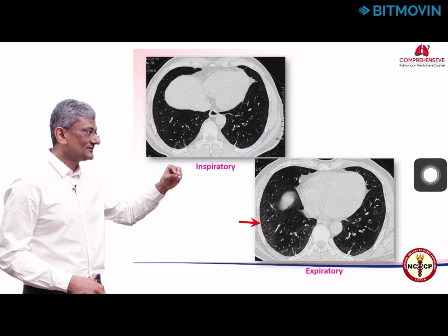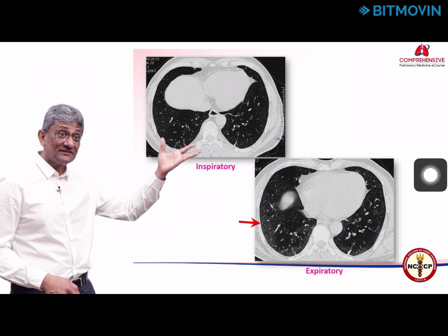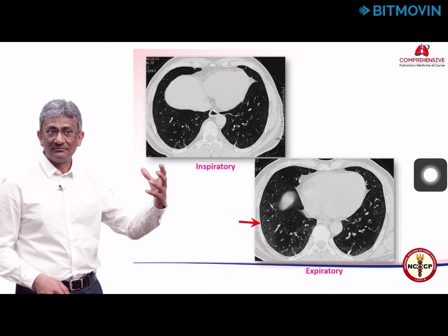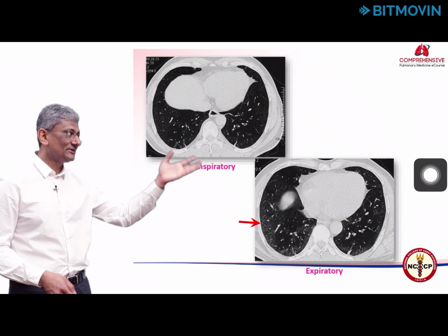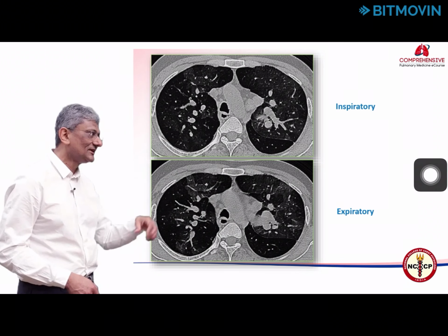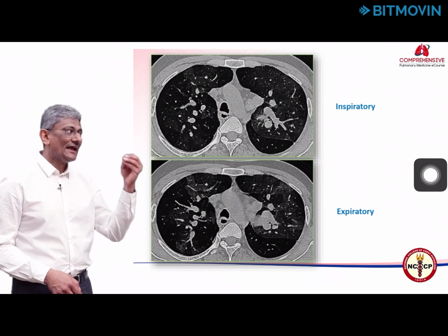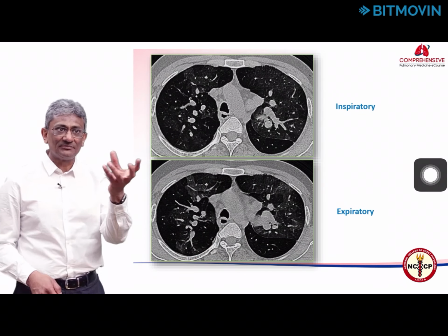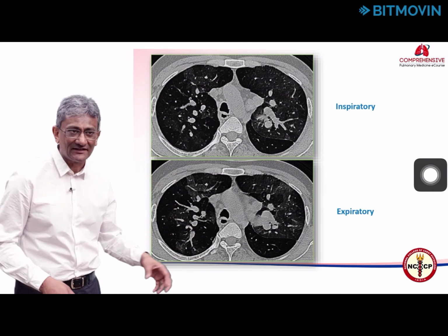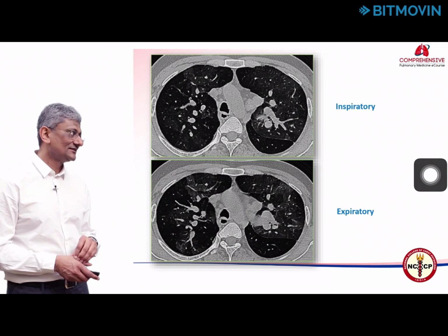These white areas show a gradient and become whiter on the expiratory images, telling us that this is normal lung, and the black areas become blacker, telling us there is air trapping. So this is small airways disease, and in chronic pulmonary thromboembolism, the black and the white areas will not change significantly. And because the white areas represent hyperperfused lung, we see fat vessels there, we will see MPA dilatation, and it should generally be possible to make that differentiation.